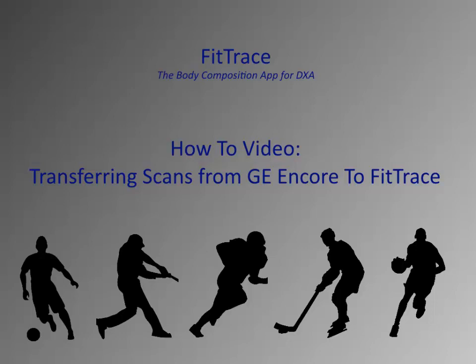In this video, we will demonstrate how to transmit body composition scans from GE's enCORE software to FitTrace, and how the client or patient can access the scans using the FitTrace web-based app. There is a more streamlined way to transmit scans for team environments, which is demonstrated in a separate video.